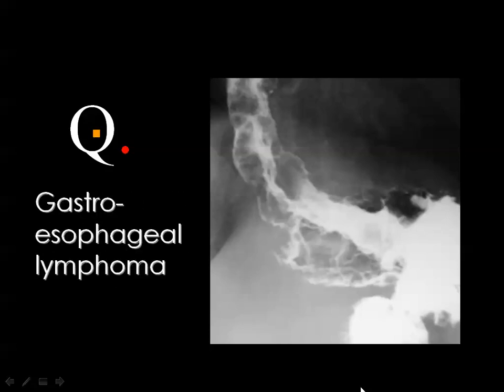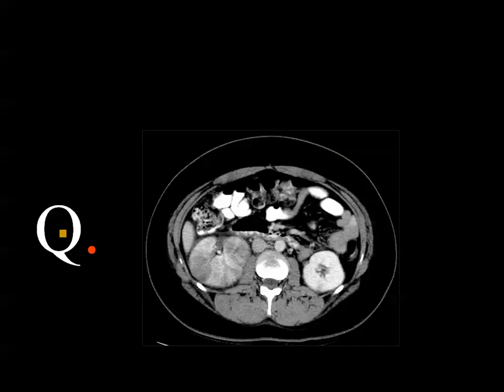And this is a barium study for the gastroesophageal junction, showing multiple filling defects in the mucosal prominence in the gastric fundus, and the varices are usually of a smaller caliber compared to these very big filling defects. Then you consider this as lymphoma affecting the lower esophagus and the gastric fundus, or carcinoma affecting one of both anatomic regions and extending to the other part, and this was gastroesophageal lymphoma, based on the prominence of the mucosal folds and the long segment of involvement.